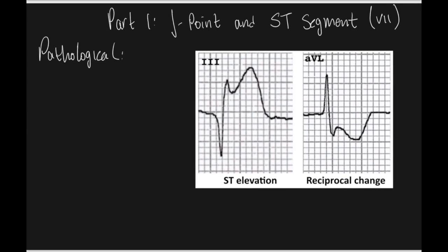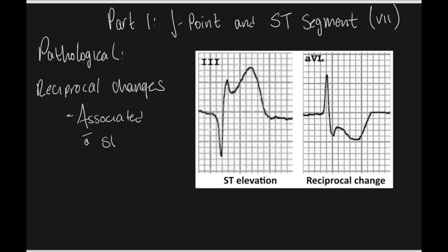Another change that is pathological within the ST segment and the J point is reciprocal changes. Now, these are associated with ST elevation elsewhere.